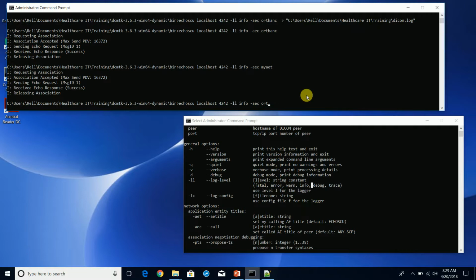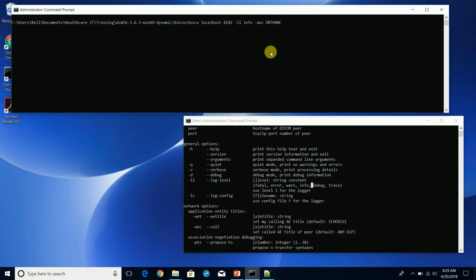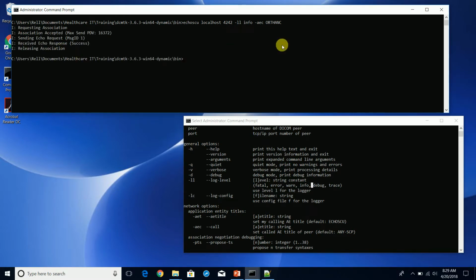So now that that's been restarted, let's go back and do, which one do we want to do? Yeah, let's just do this. Well, first, let's just clear the screen. There's too much going on here. All right, so now if we do a title, success.